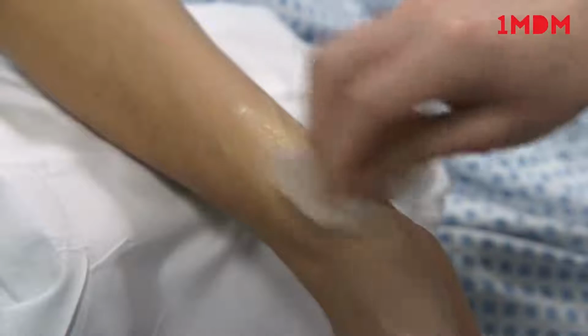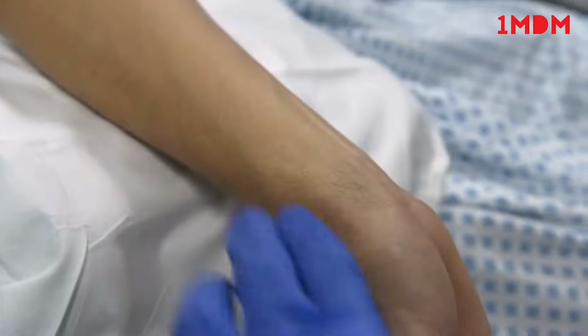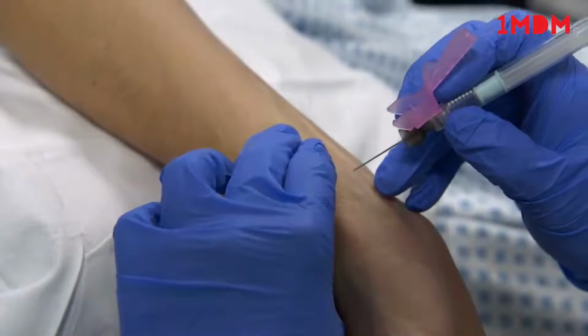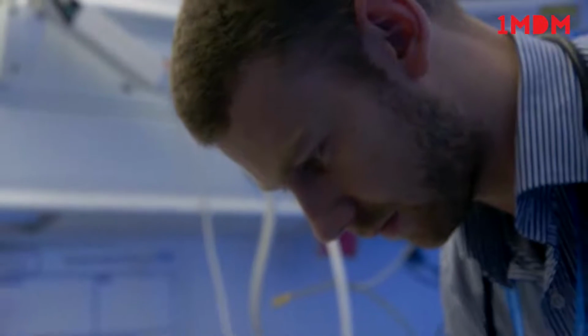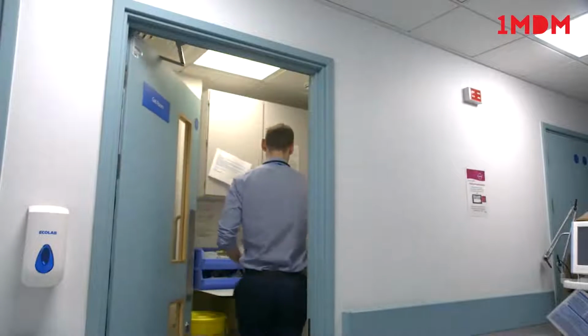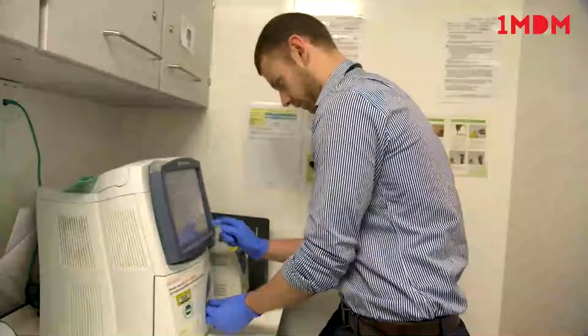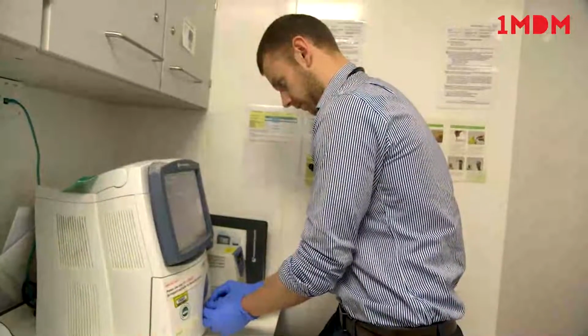Following initiation and after any change in settings, an arterial blood gas should be taken at 1 hour. In the event of clinical deterioration, it is important to repeat a gas to ensure your patient's CO2 isn't rising further. If your patient is likely to need multiple ABGs, it will be worth considering whether they need an arterial line, remembering this determines which clinical area they can be managed in.